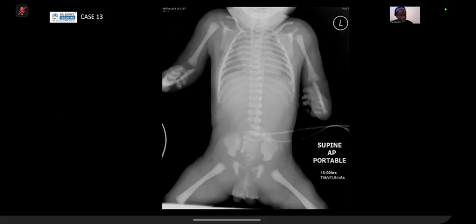Okay, that's fine. I'll tell you about the rest. So in cases of tracheoesophageal fistula, we have to assess for something called VACTERL, which is a syndrome, because esophageal atresia and tracheoesophageal fistula are associated with other developmental anomalies. So on this radiograph, we can see a couple of them. So V is for vertebral body. So we're looking for any vertebral body anomalies such as hemivertebrae, fused vertebrae, and things like that.